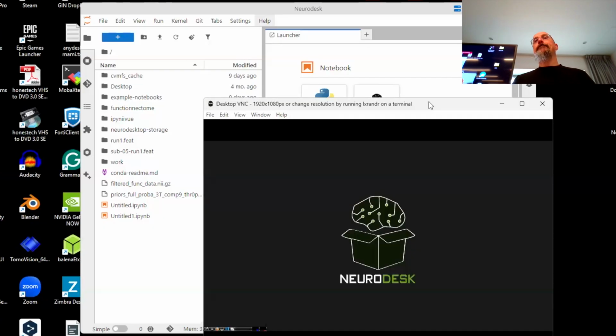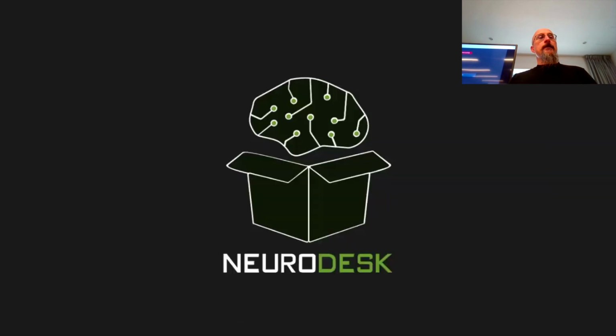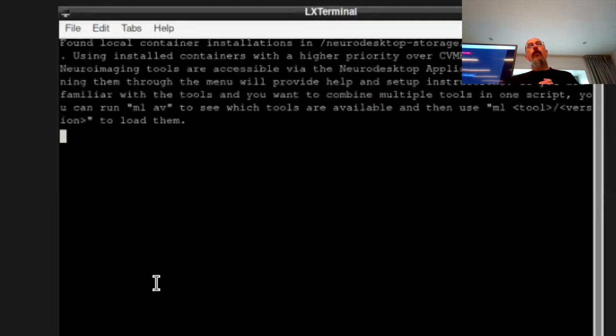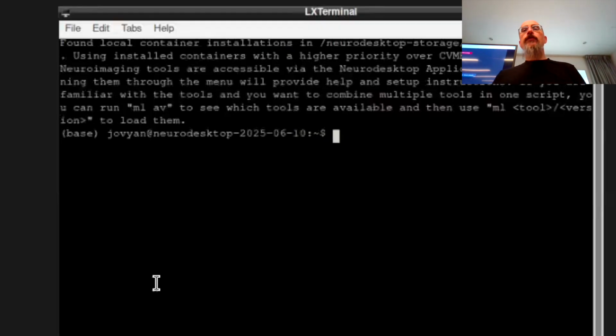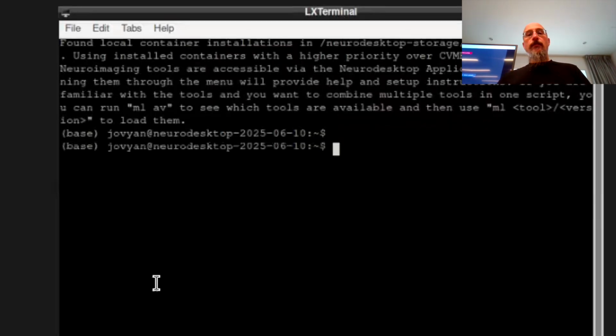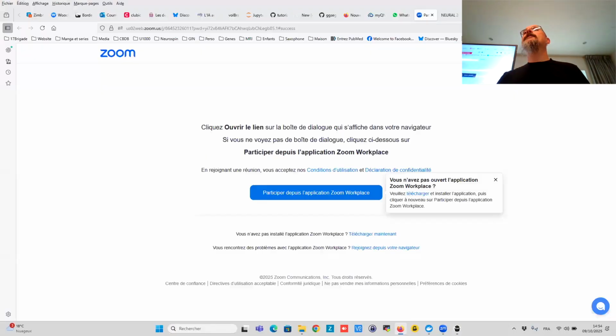Okay. So we were at the point, so let's open Functionnectome through the GUI. If you install it, normally you should just have to do that. So if you go back to my GitHub tutorial, let's see where it is.